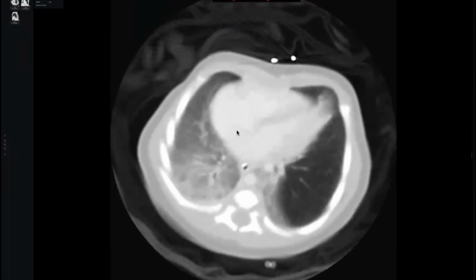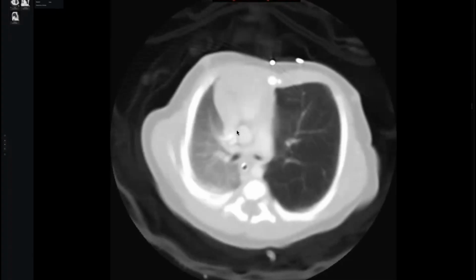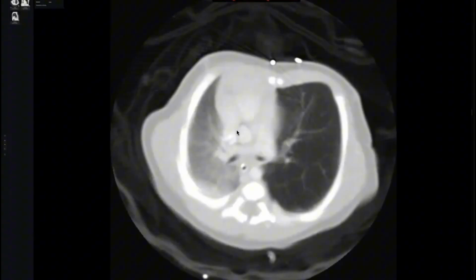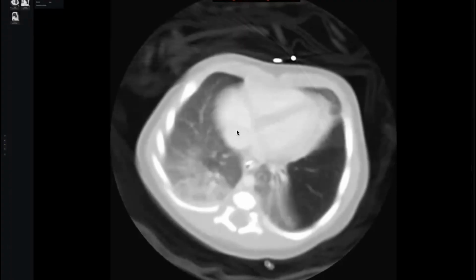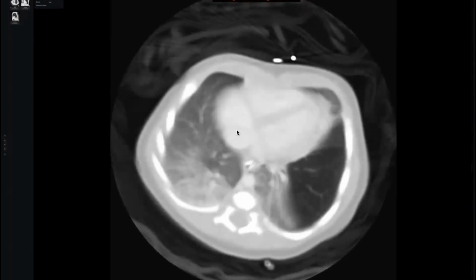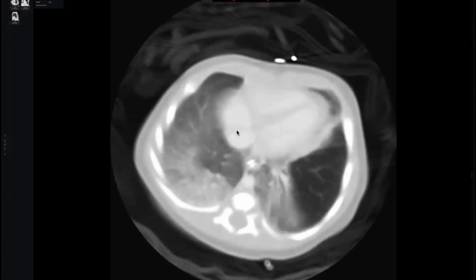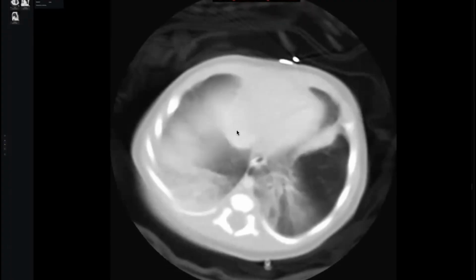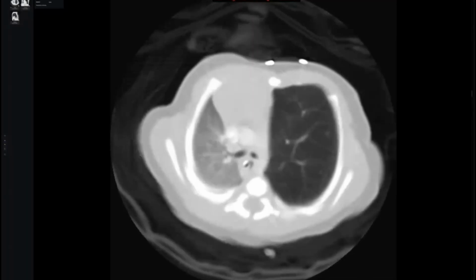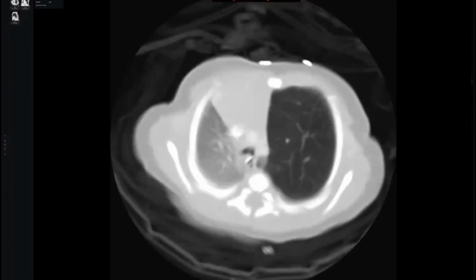So this is the CT chest. Lung window shows there is air trapping and hyperlucency of the left hemithorax with paucity of the attenuation of the pulmonary vessels. Which lobe? It's in the left upper lobe. Okay, so this is most probably Swyer-James.